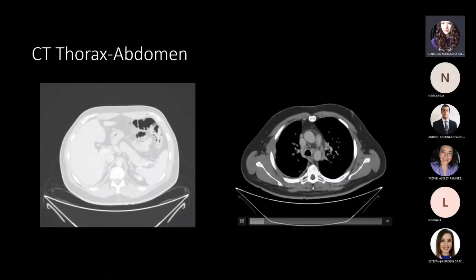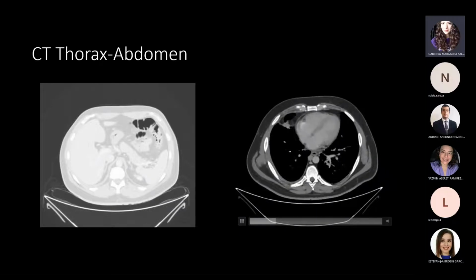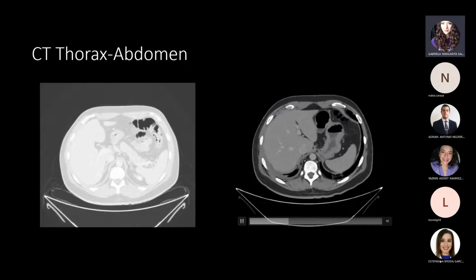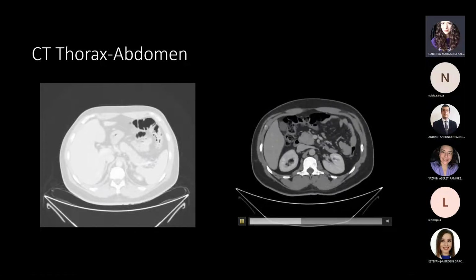In the thorax and abdomen CT, we can also see multiple adenopathies, mediastinal adenopathies.